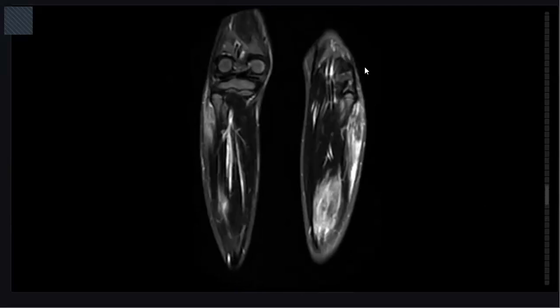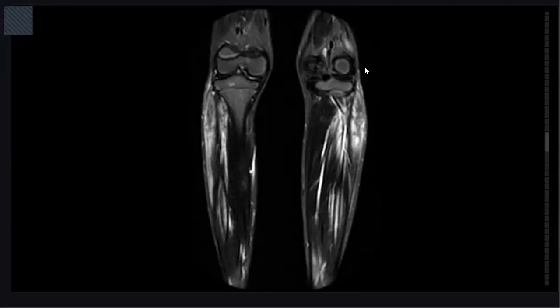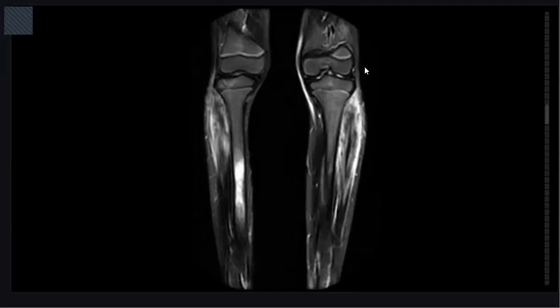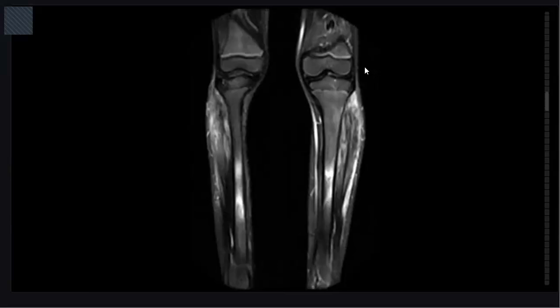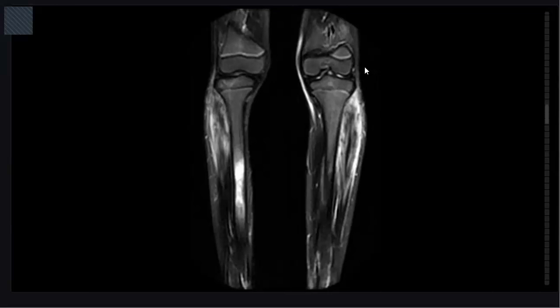I am scrolling through the images for assessment of the bones. Yes, here I can see there is bilateral affection of the tibia at both sides with rather similar findings to that of the radius. The soft tissue affection also has rather similar appearance. All these findings with the elevated inflammatory markers of the patient raise the possibility of CRMO, chronic recurrent multifocal osteomyelitis.